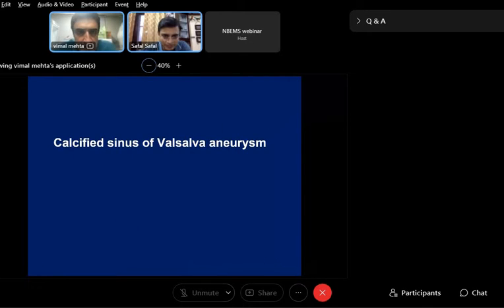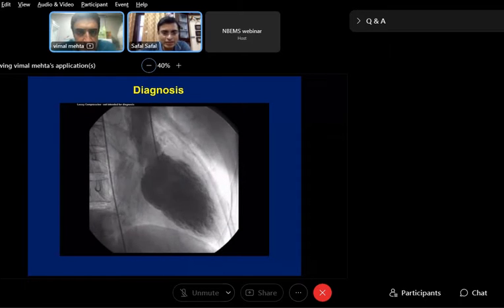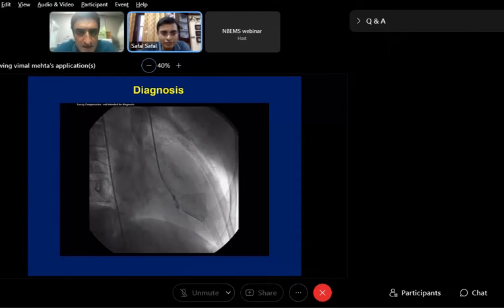So this is calcified. Dr. Safal, you want to say something? So very good mistake that somebody has made. Everybody will gain from it.